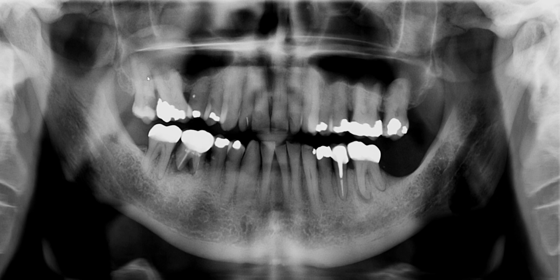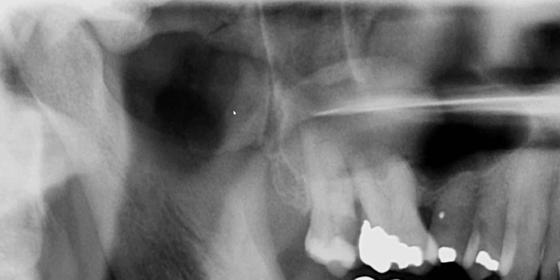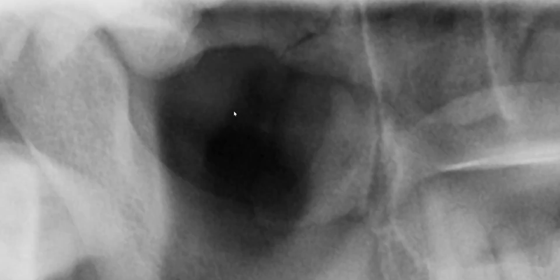So I'm going to zoom in a little bit to better visualize the area and see if you can come up with a proper answer to this appearance. Okay, so I'm going to zoom in. Let's see if I can go in even further. Is that too much? Anyway, this line here.